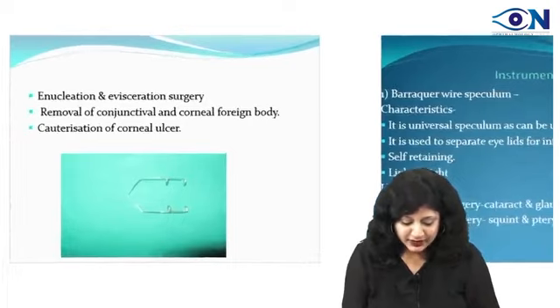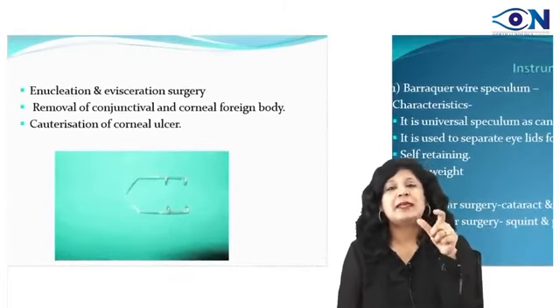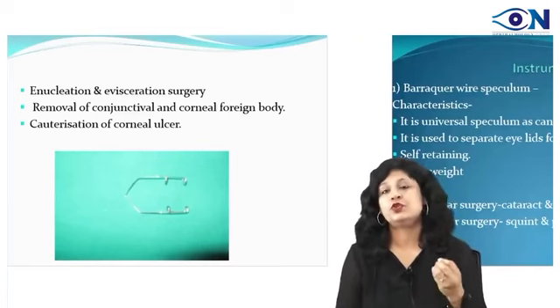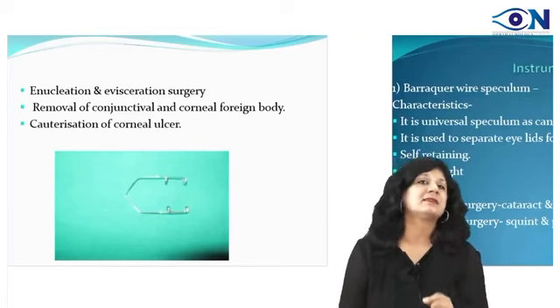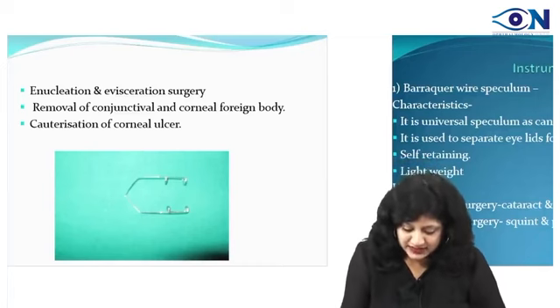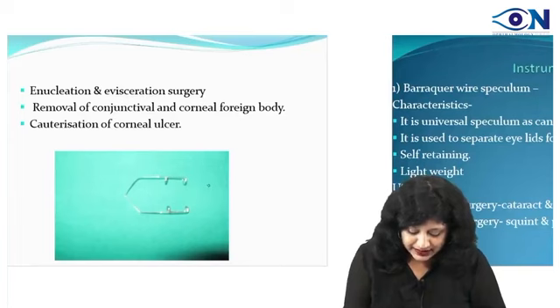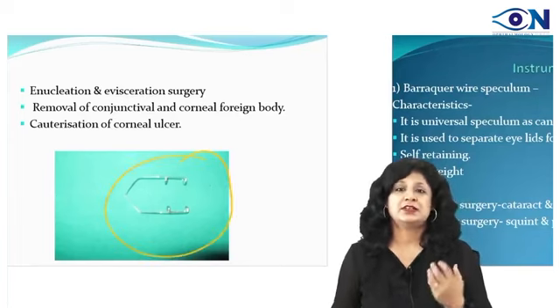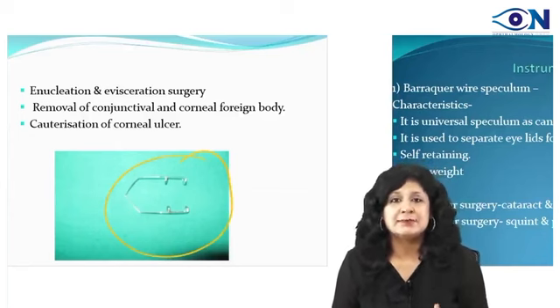So in the first one, I am beginning with the very basic instrument, and that is one instrument that you use a maximum of the times. So can you see this? What is this actually? This instrument is a universal speculum. It is called as the speculum.